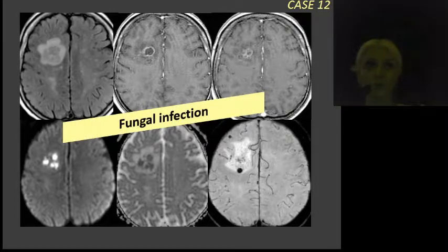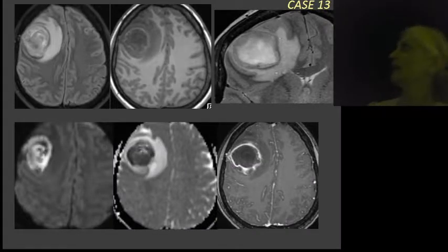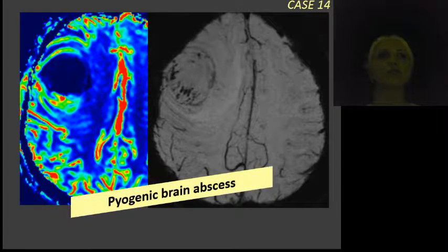So you see, you always combine the little pieces. This is a huge one, again, a lesion in the frontal lobe with several layers here, inhomogeneous ring enhancing. You add perfusion and SWI, and this ended up to be pyogenic brain abscesses. So you see, everything was good until SWI. I just told you today you should see a dual rim sign. Be careful, not always you will see a rim sign. If you see it, it will speak for pyogenic brain abscesses.